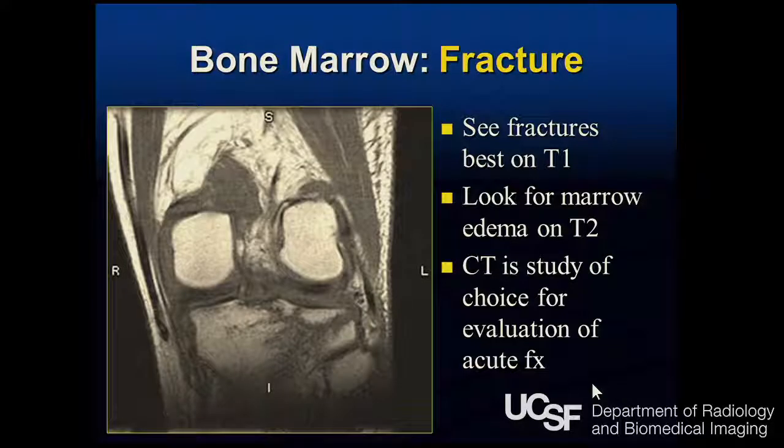A couple of miscellaneous findings again. Tibial plateau fractures, especially non-displaced ones, can be quite subtle on initial x-rays. The patients will continue to manifest pain, and so this would not be a diagnostic dilemma on MR. We can see linear areas of low T1 signal consistent with a tear, but remember CT is going to be the study of choice, and the Schatzker classification for these lateral plateau fractures is going to be made on CT.